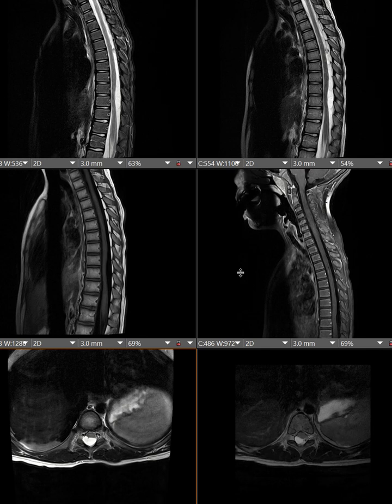Hello everyone. I came back with a very interesting entity today. I just want to show you an MRI of the cervical and thoracic spine of a 10-year-old that presented with back pain and some sort of weakness.